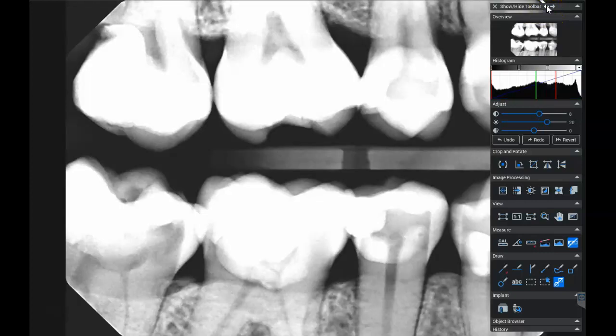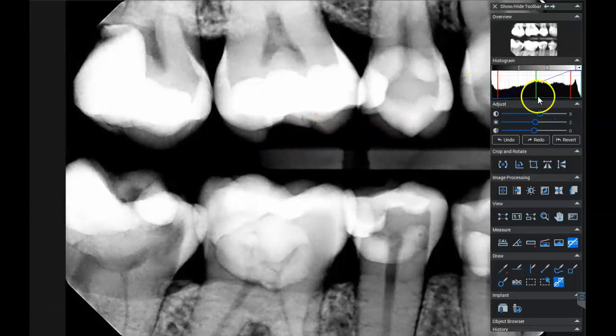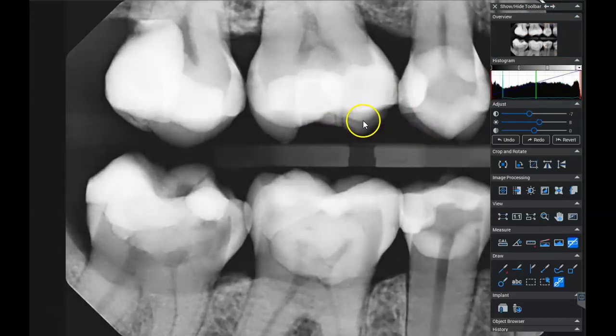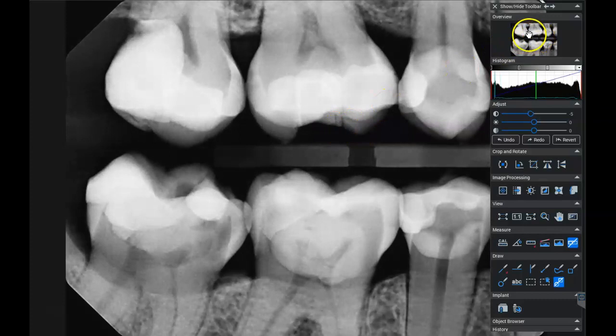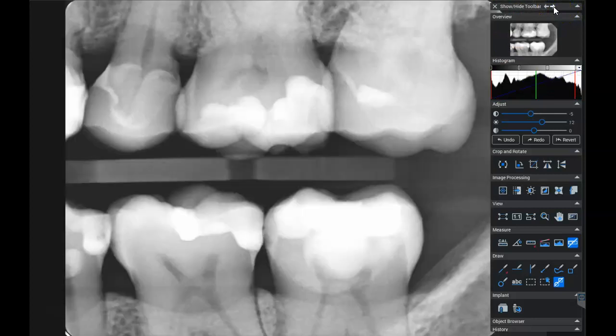So in order to change the one I want, I have to completely cycle through multiple different thumbnails. Here again, the one that I'm changing now is actually showing up here and it is changing. But there are times when the thumbnail here does not match, just like just happened. I just went back, and now I'm trying to change the resolution. This bar is moving all over the place, but it's changing that thumbnail, which does not match this thumbnail.